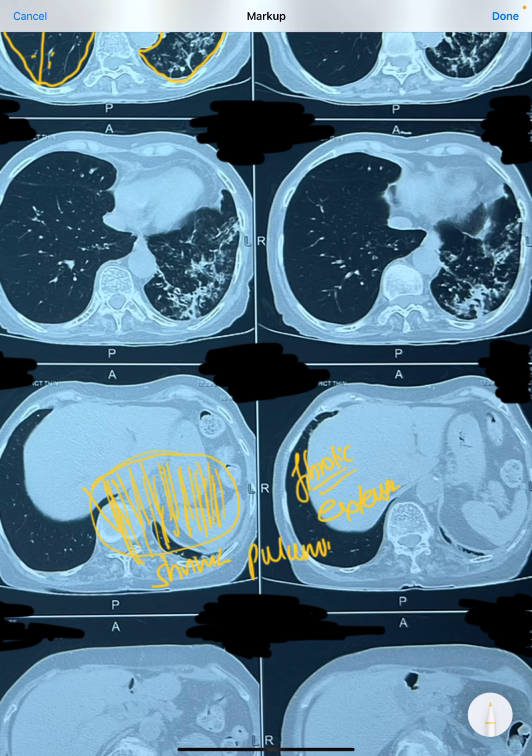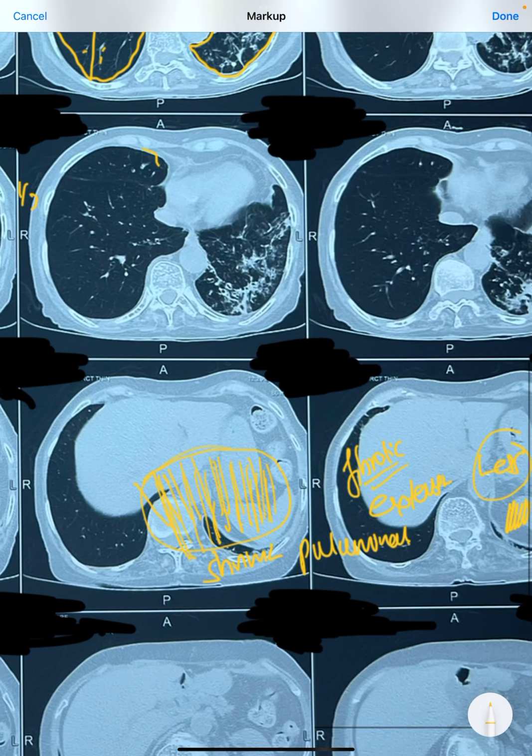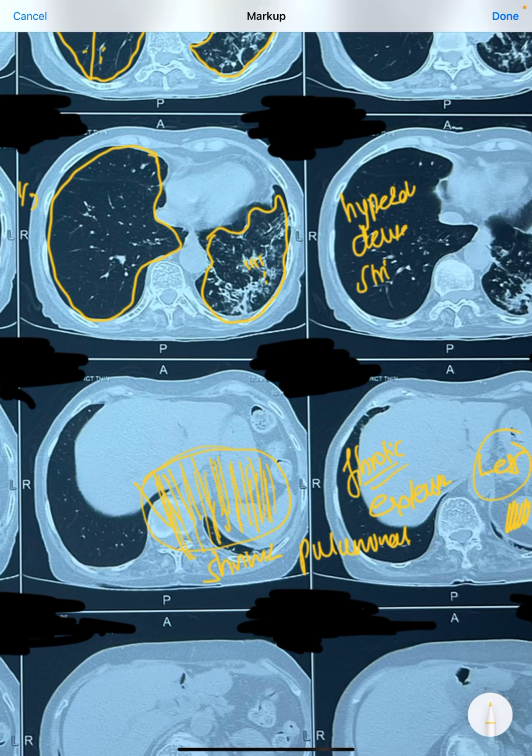Once there is shrinking of the lung parenchyma, the lung volume will become less. So what we are able to see here, compare here also, on the right side there is huge normal lung parenchyma, but on the left there are significantly shrunken lung lobes. This shrinkage is because of the fibrotic bands which appear hyperdense, dense white streaks. See, this is not very dark bright, and there is no shrinkage.